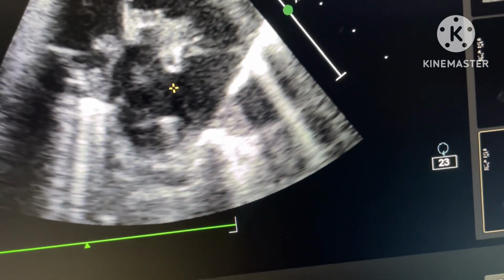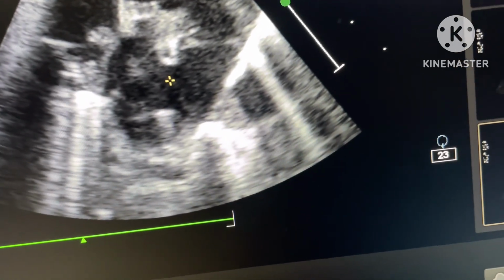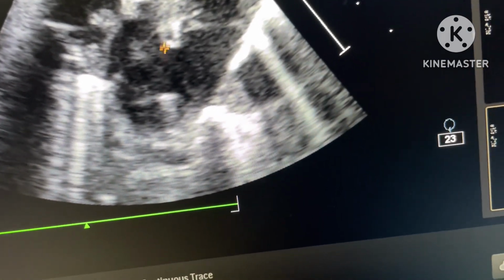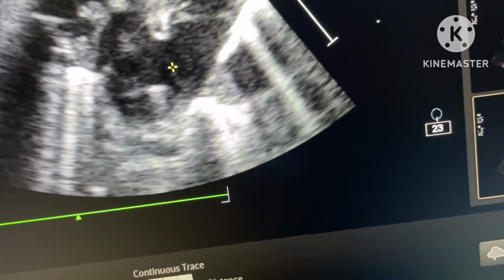More echogenic end portion is not the finding when there is echo dropout. Like in apical four chamber view, septal dropout you will say that is dropout. In that case of dropout, you will not find the echogenic margin. So whenever you find echogenic margin, that means there is definite defect, or true defect you say.